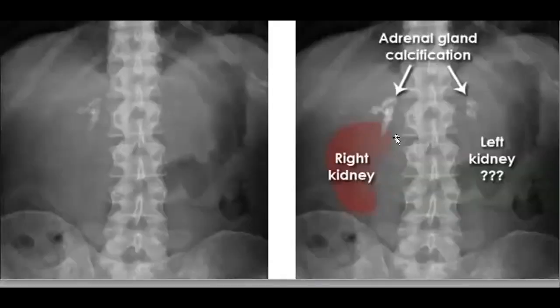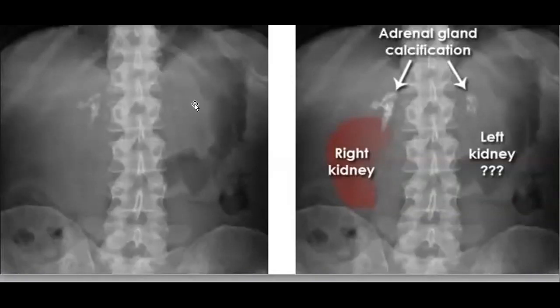One of the commonest in the exam is that they can present you a picture to show you adrenal calcifications. And then the discussion with you will be about possible causes. Again, it will be TB, previous TB, or adrenal hemorrhage. And also you can involve some diseases like Wolman disease. Yes, thank you. Yeah, Wolman, okay. We mentioned it before.